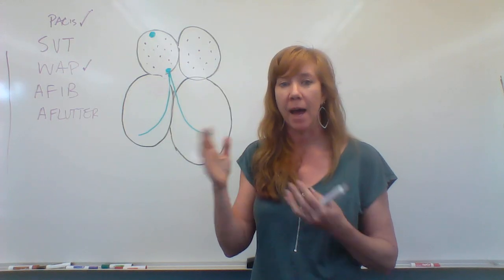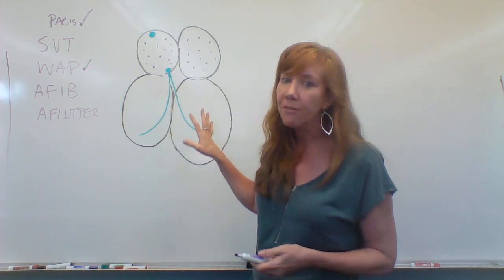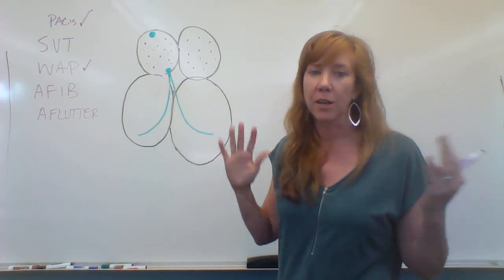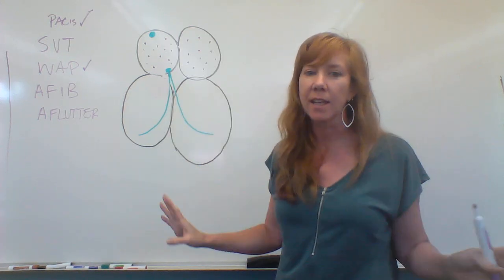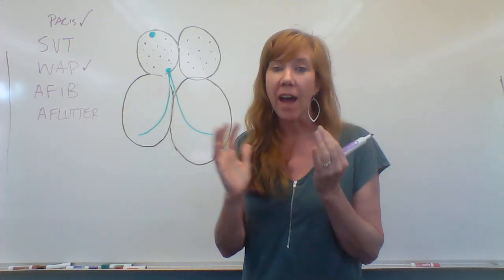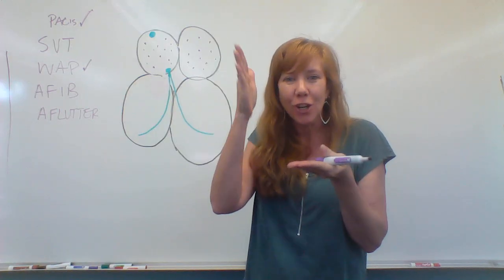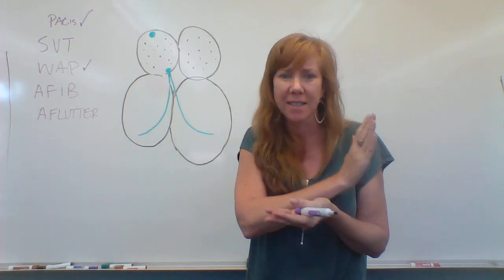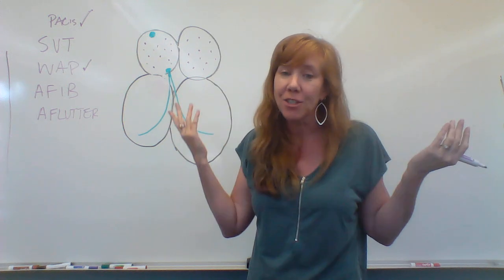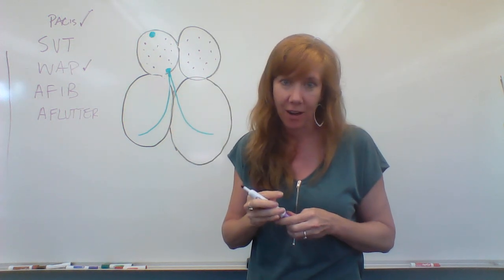So there's a pattern to the irregularity of the rhythm, but not AFib. AFib is just irregularly irregular, meaning it's completely random. If the rate is very fast and everything's scrunched together, it might look like some of them are spaced the same distance apart because it's all close. But that's just chance. It's not on purpose ever.